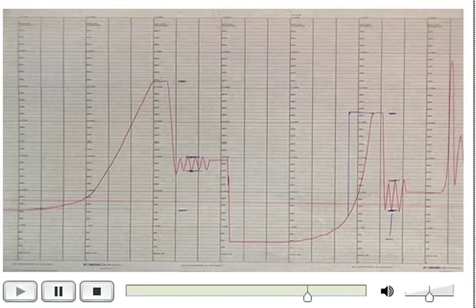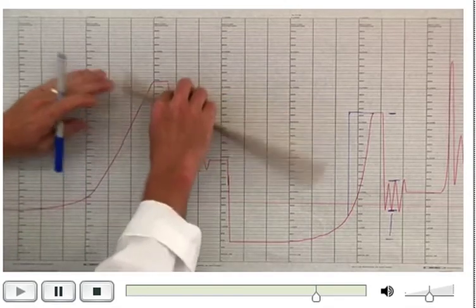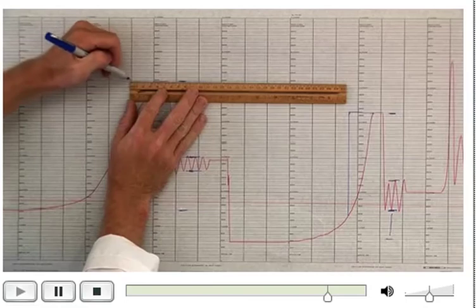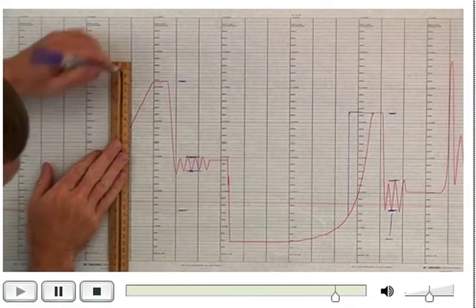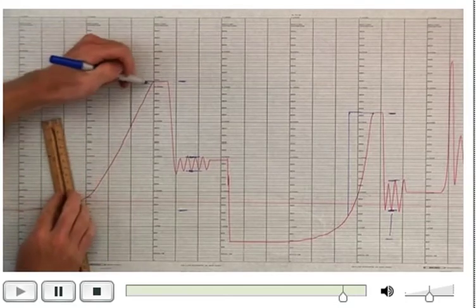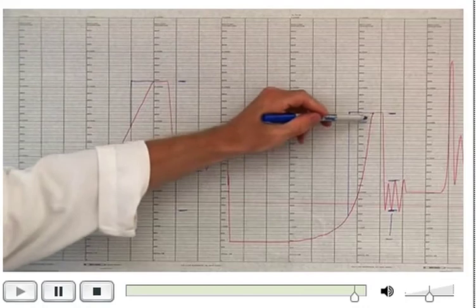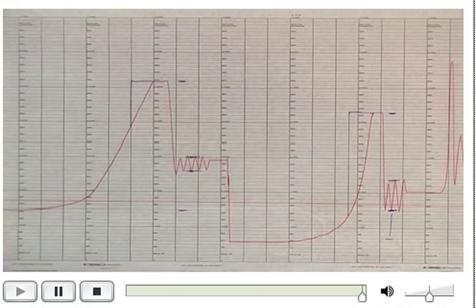What's noticeably different with the obstructed breathing is the FEV1, the forced expiratory volume in 1 second. You can see again if we're coming over approximately 32 millimeters, which would be that line in fact, in 1 second, that's how much of the total vital capacity was pushed out in 1 second obstructed versus how much was pushed out in the unobstructed. This is the main value that changes with the obstructive lung disease.